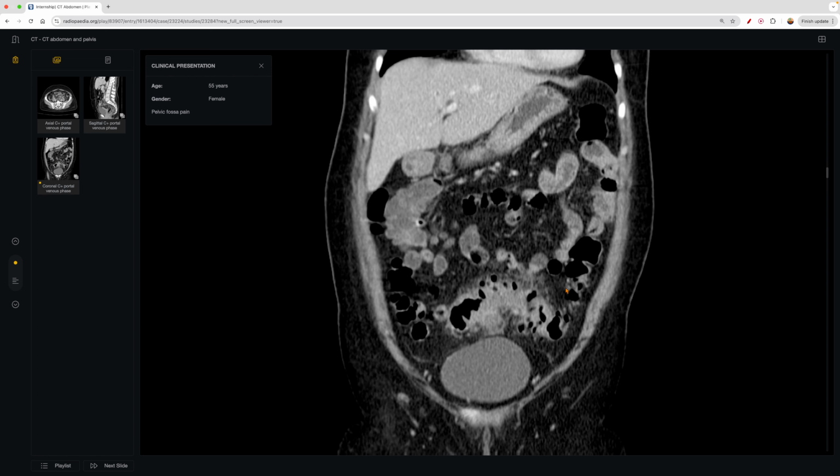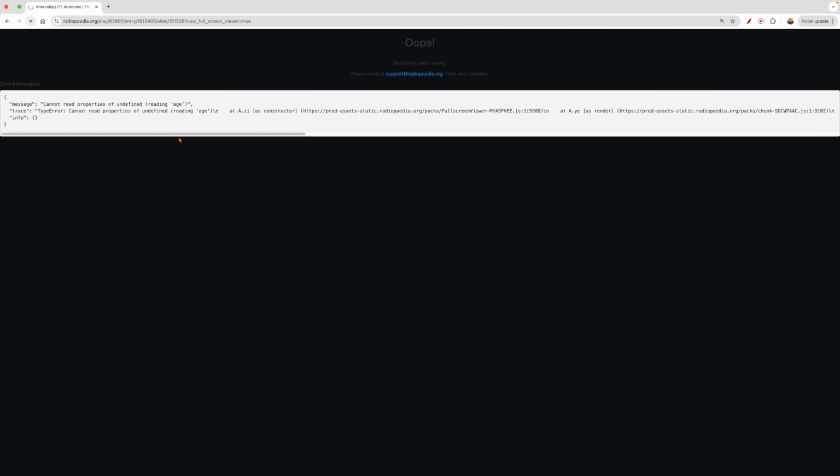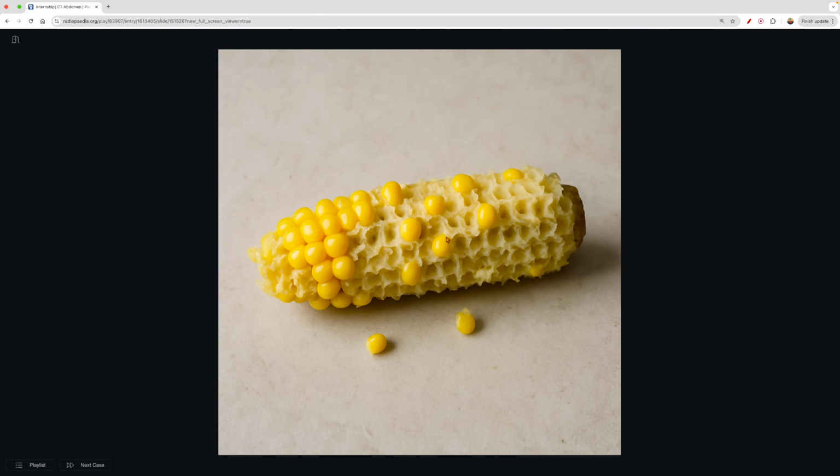Just looking at the colon, sometimes you'll see these, but you won't see the inflammation, and that's the clue for diverticulosis. Diverticulosis is the absence of the inflammation, so you're not going to see this gray hazy opacification. And to me, I like to think of diverticulosis as kind of looking like corn on the cob, right?